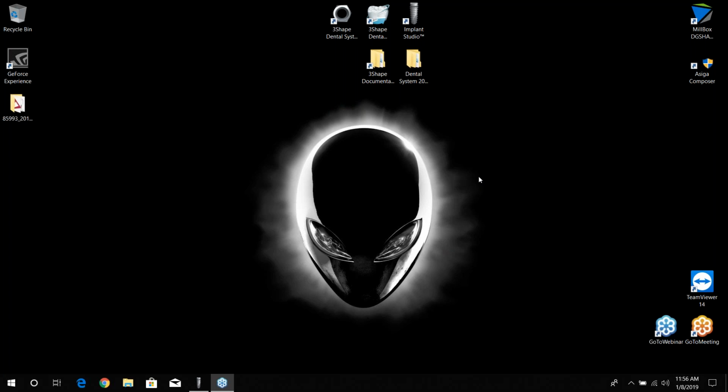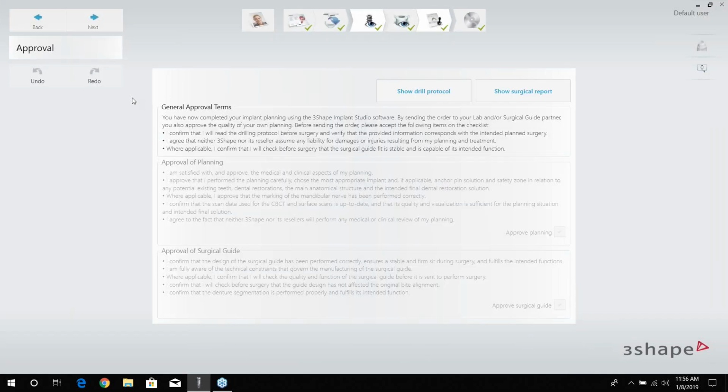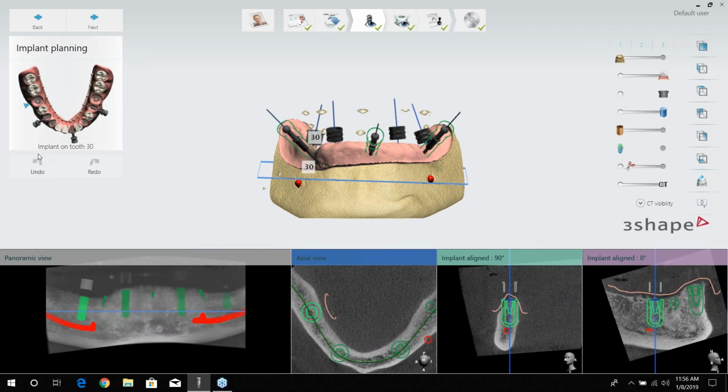If you needed to change the diameter or the implant platform, you would have to go back into the implant library section, which is not showing here, but it's where I was selecting the implants. If you need to change the platform, you have to go back in there and select a different platform. Or if you're switching manufacturers, you have to go back and switch manufacturers. But once you select the implant, the software changes it for you. And then length you can control straight from these implant line views.